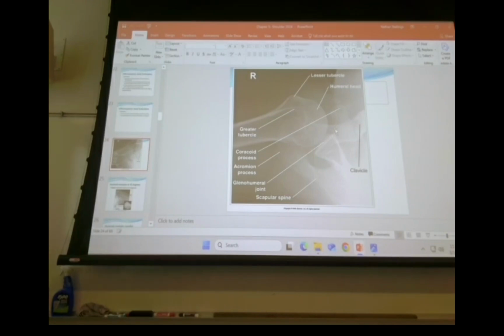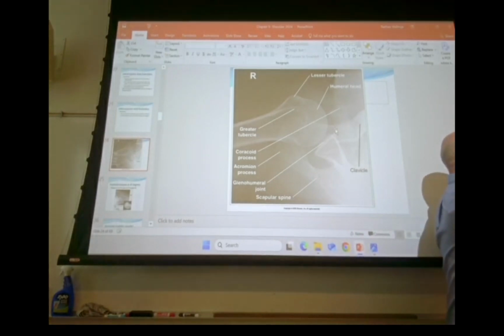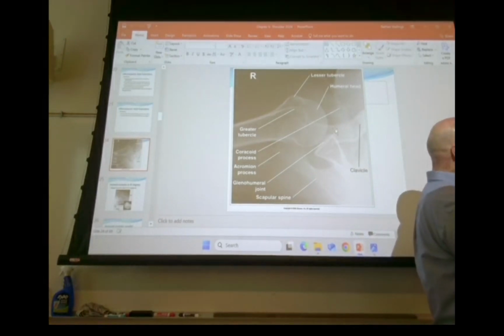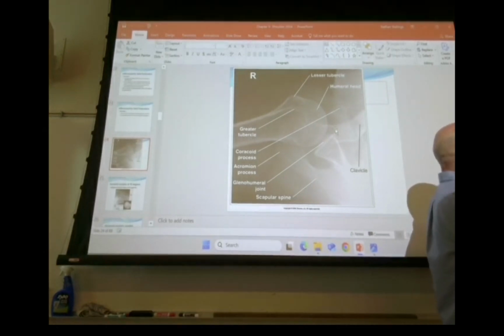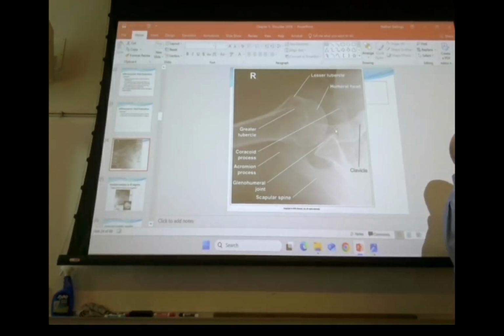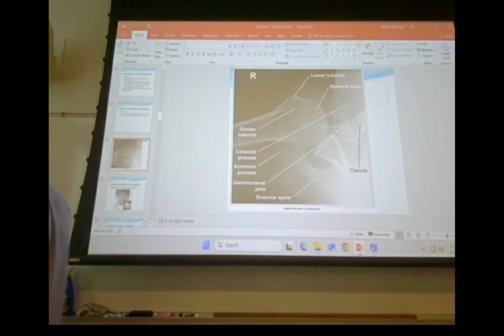Okay? So then what happens is if those two don't look like they're superimposed, or not superimposed, but one's coming out of the other, then with the increased angulation, you're going to project the coracoid process away from it. Under angulation, the coracoid process is going to look like it's coming out of the top of the glenoid fossa instead of out of the side of it.